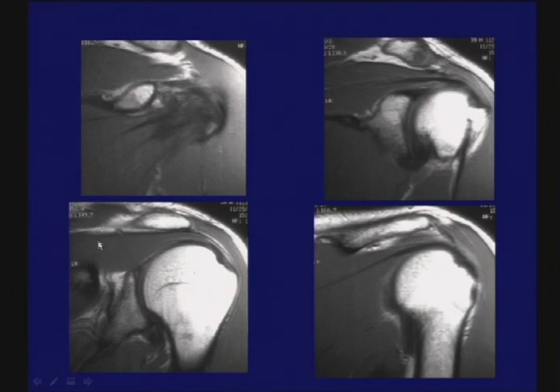We go a little more posteriorly, bottom left, we still see that we have supraspinatus muscle and tendon, and you'll see a portion of it is now attaching to an obliquely oriented facet. This is the middle facet. We go more posteriorly here beneath the acromion. We can appreciate the infraspinatus muscle, the main muscle belly.